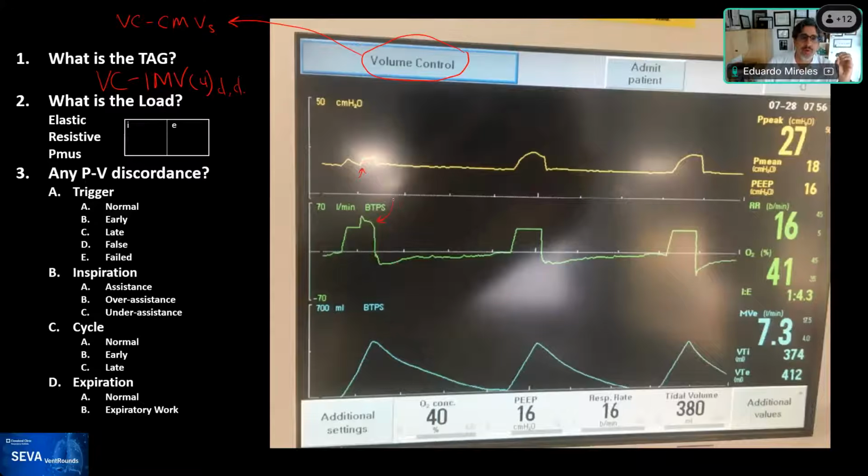And it's important for you to recognize this, because if you're looking at the patient-ventilator waveform, that's an important finding, and it explains a series of things that we're going to talk about in a second. But the second part that I want you to be aware of, even though there are several forms of dual control or different implementations, is that this is how it's implemented on this ventilator in particular. There are different targeting schemes for dual out there. In this case, it's related to the presence of Pmus on volume control.